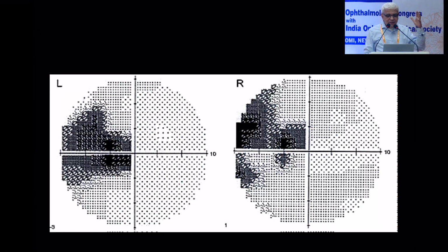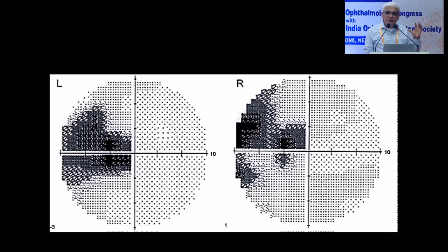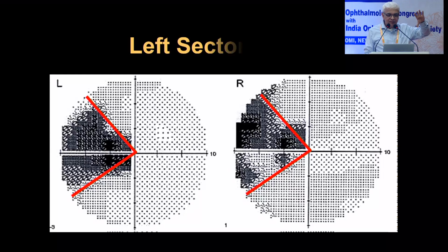Okay, these are a little odd. You can see they have a homonymous kind of a flavor because they are both on the left side, but they are not completely hemianopic. There are areas which are spared up and below in that hemifield. Okay, this is a sector. It's not a quadrant, it's a slice of a cake maybe. So this is a sector anopia.